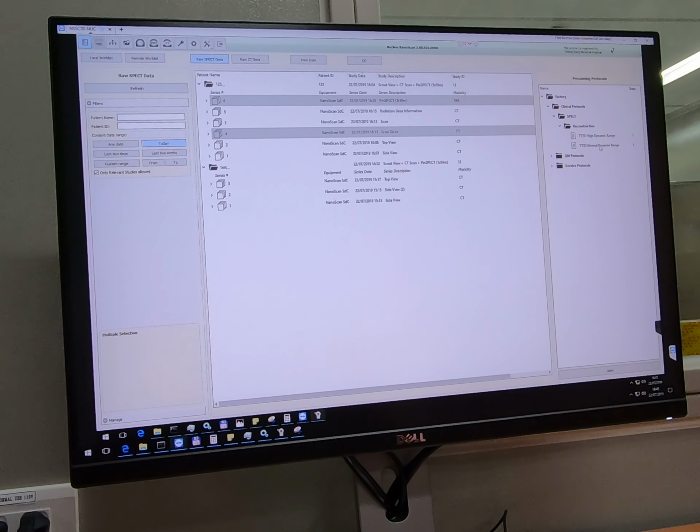It should be selected if you have a scan of an organ. For example, you are scanning only and you want the image only from the lungs or the heart, but you injected something which accumulates quite highly in the liver, for example, which is really close to your region of interest.